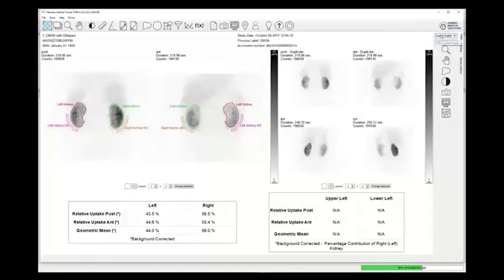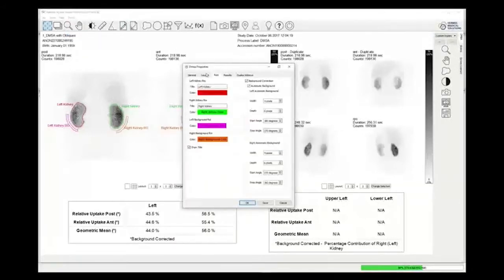Whilst in the past you had to have two separate DMSA entities, one for your non-duplex and one for your duplex kidneys, now you could have just the one entity within your gold, and you could flick through accordingly if needed.